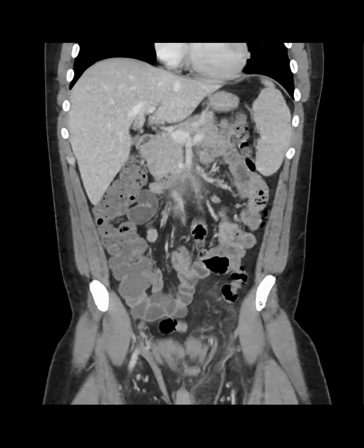All right, the next case is a little bit of, this wasn't picked up prospectively, and it's hard to blame, knowing what happened. Does anybody see anything that they would be concerned about or question or raise eyebrows about?